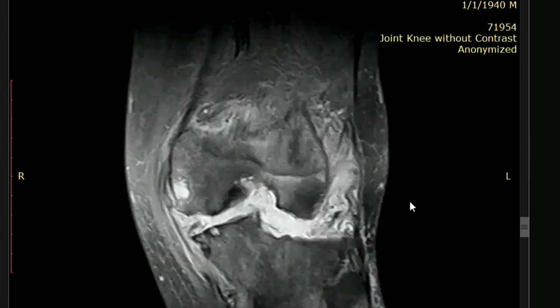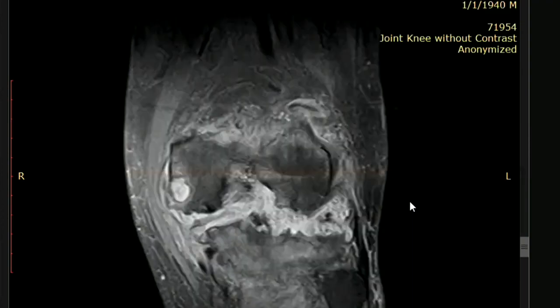I can also see loss of epiphyseal cartilage, and significant soft tissue swelling and edema within the subcutaneous soft tissue. So a lot of erosions and subarticular geodes, but no osteophyte formation, and extensive erosive changes with joint effusion as well as the subluxation which was seen on X-ray. So yes, it is again supporting the diagnosis of erosive arthropathy.